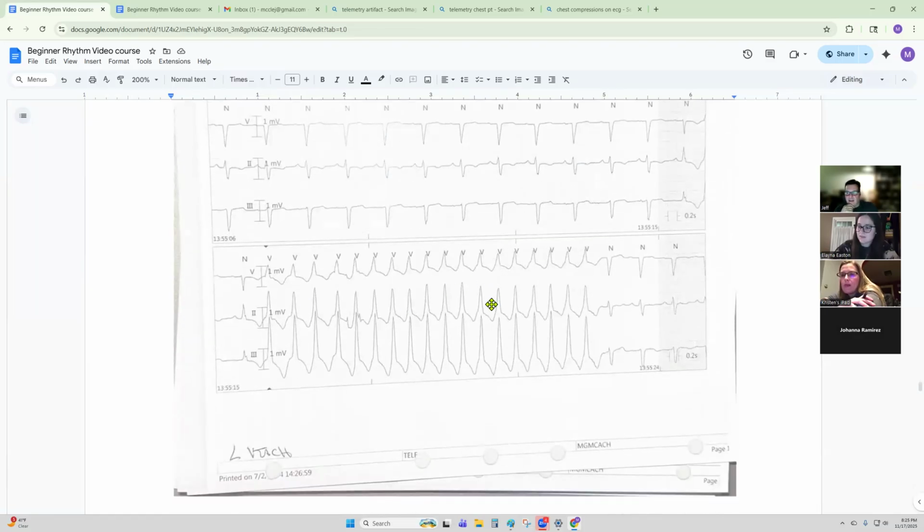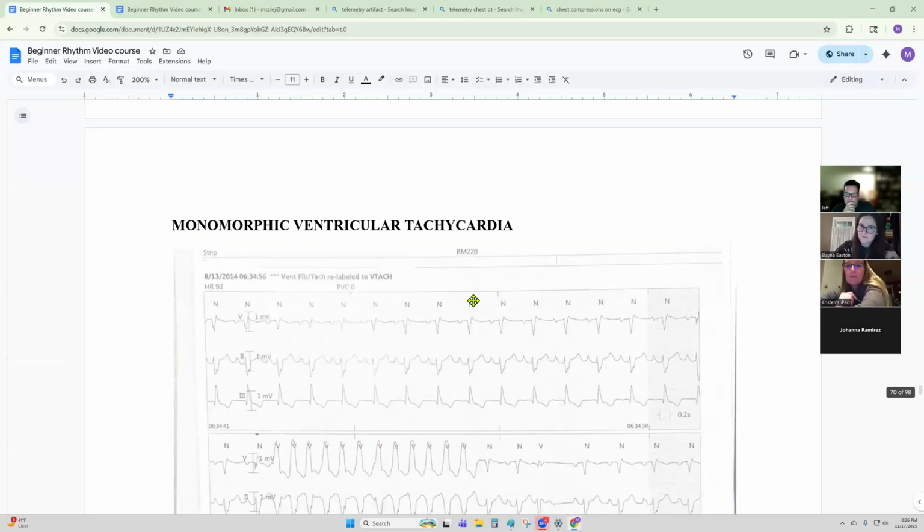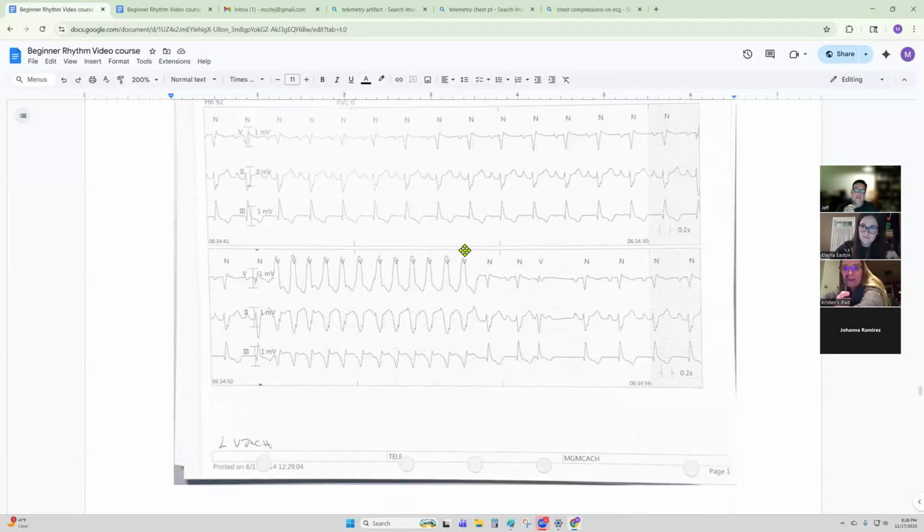Where this left PVC, this left VTAC, see how it's straight up off the baseline? And left PVCs, I think they're very pretty because they all go positive, like with left ventricular activation, because it all goes towards that brown lead. So they're all going to be positive. And wide. Yeah, wide, of course. Thank you, Kristen. And sometimes regular. Most of the time, you'll see regular with it.